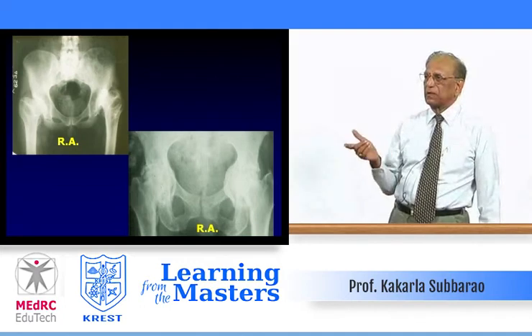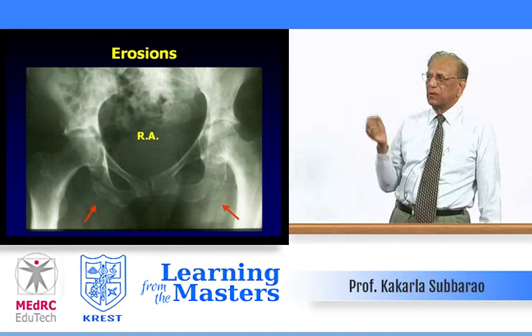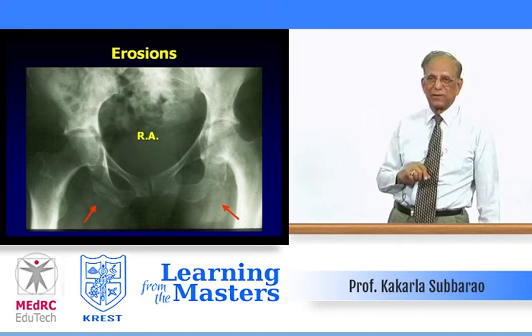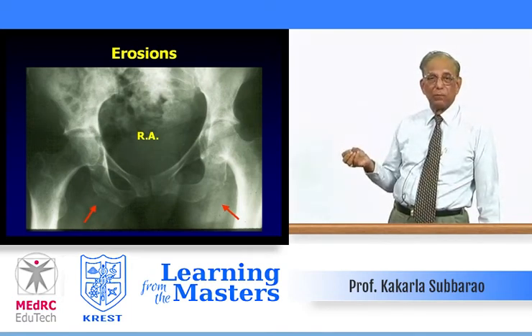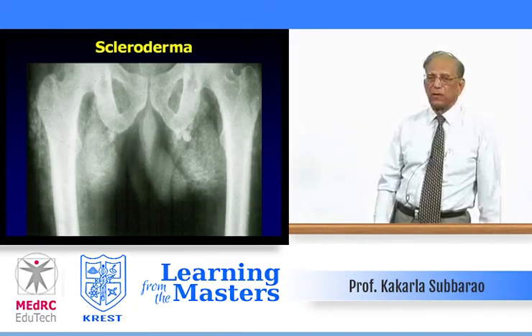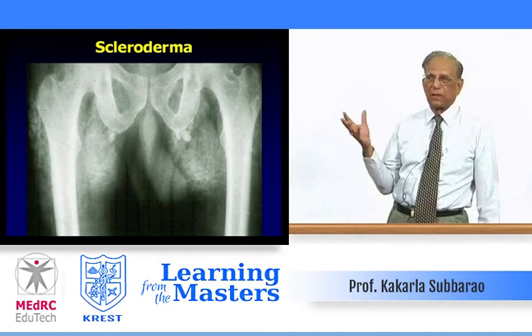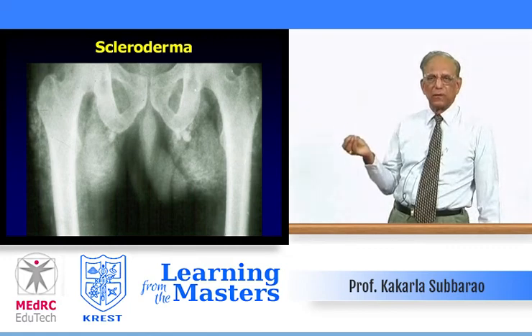Again, rheumatoid arthritis with predominantly erosions and thinning of the acetabulae, erosions on either side of the hip joint, and note particularly the resorption or erosions at the ischial tuberosities. Not many conditions produce bilateral symmetrical erosions. In ankylosing spondylitis, you may find whiskering. In bed sores, you may get unilateral erosion with osteomyelitis. Scleroderma, soft tissue calcifications are common. Otherwise, in scleroderma, hip joints are rarely involved.